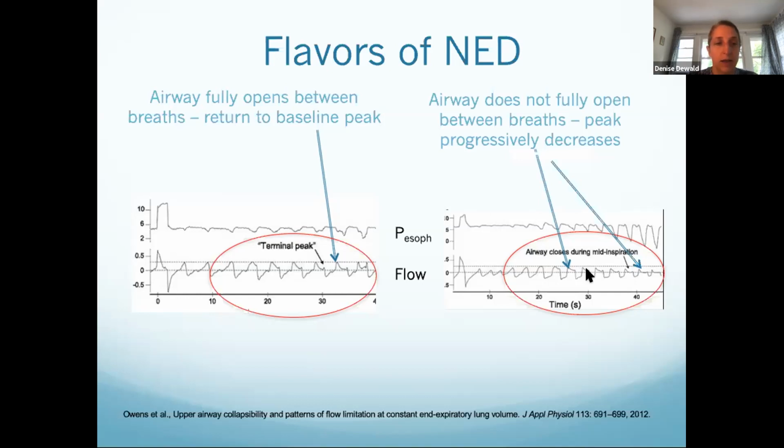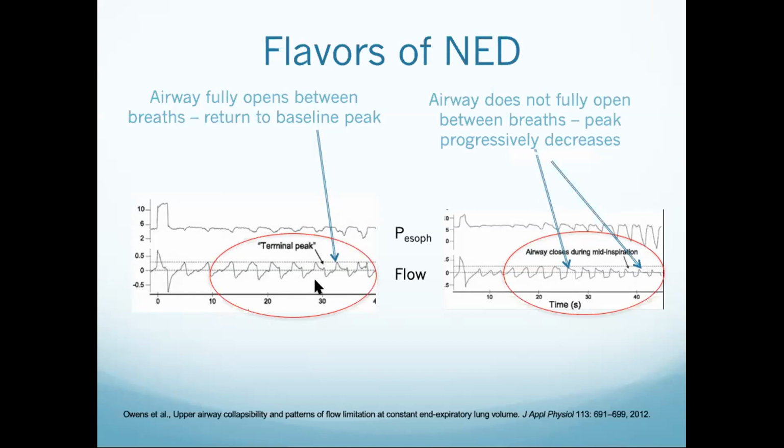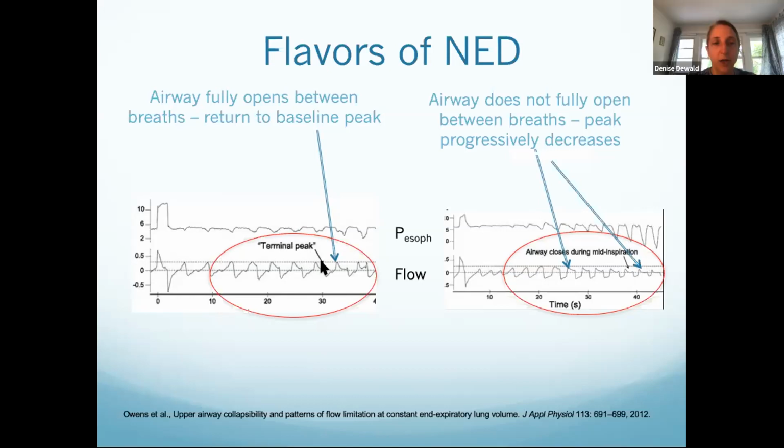All right. So what about this terminal peak? What do you guys think is happening here? That's the end of inspiration. Right, but why do you think the flow is going up?